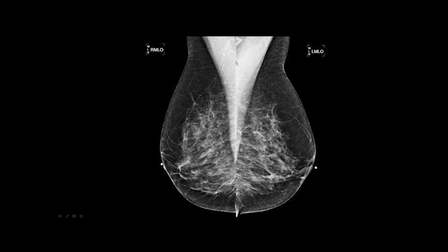These aren't bad. This is wide superiorly with a convex border down to the level of the nipple. The bottom of the breast is horizontal. The parenchymal patterns are horizontal. You can see that this is milk of calcium here. So it's held up and out, very nice. They got the tail of the breast up here. You could tell the center of the image right here is 2 centimeters above the nipple.